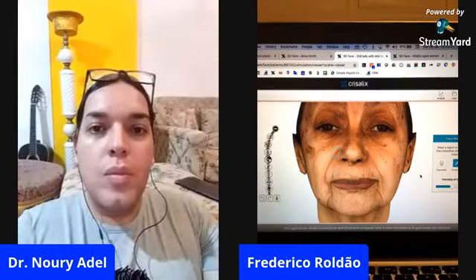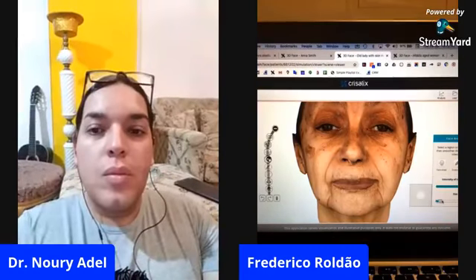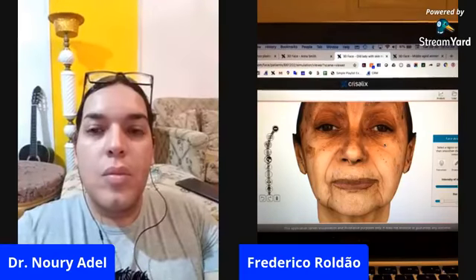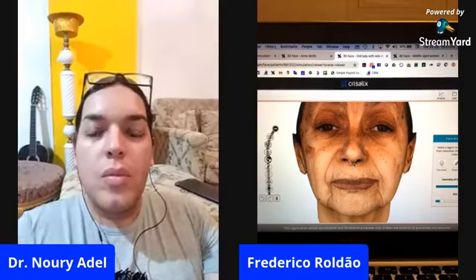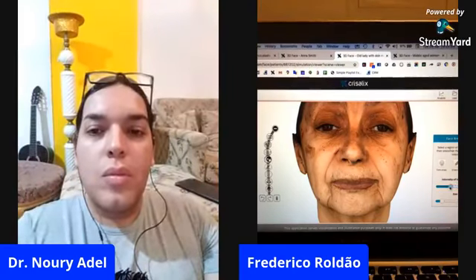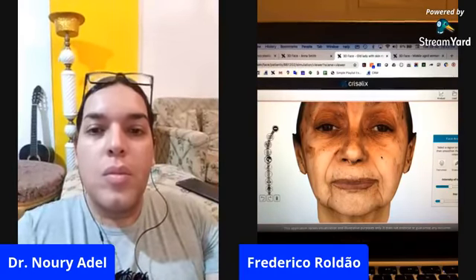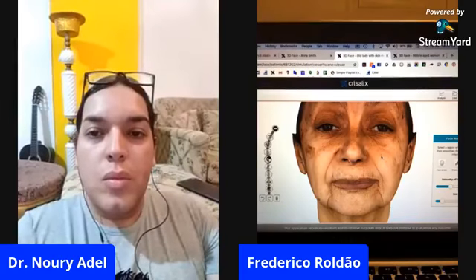Just a few days ago, we had a problem with our laser tool. Let me see if it's working now. The laser tool just resembles the effect of a laser. I think I might have exaggerated over there, so a bit less intense treatment, and working on the pigmentation, as you said. As you see, I'm firing the laser on just the left side of her skin.